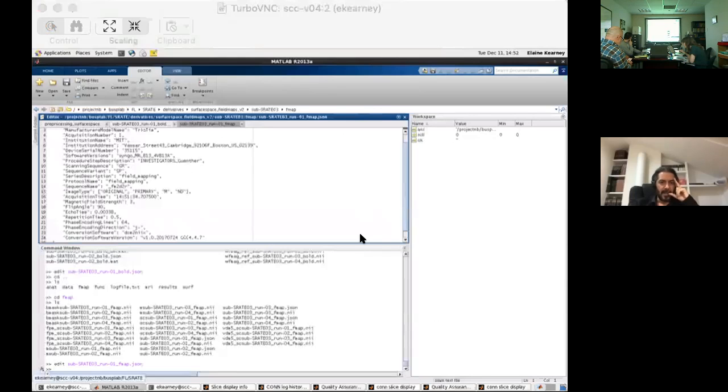This has a subset of all of the information that is in the DICOM, so digging a little deeper into the DICOMs might allow us to more confidently determine what we need to know.